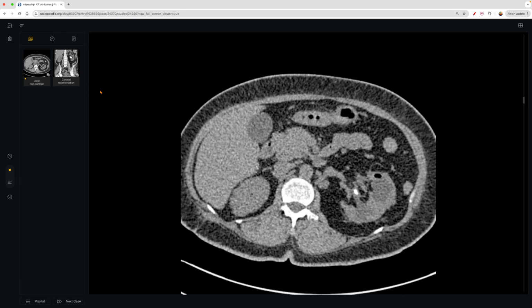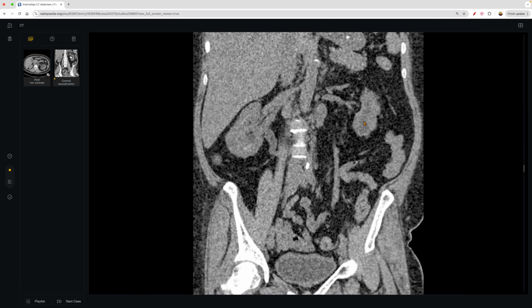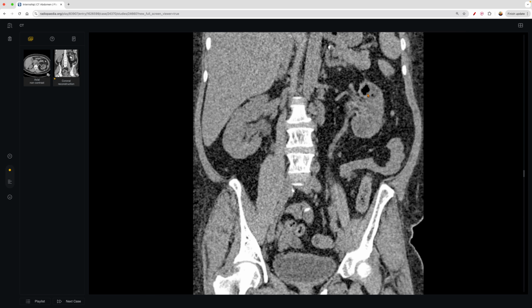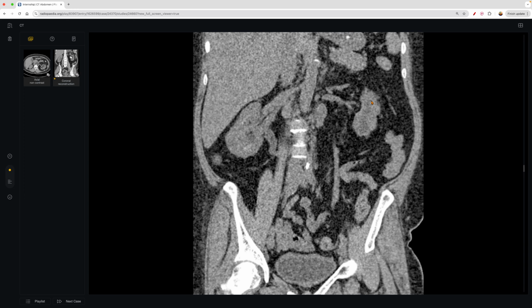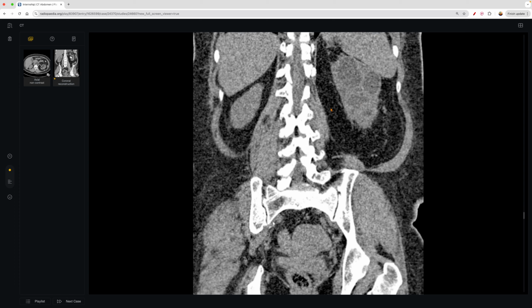All right, there's not. So that was emphysematous pyelonephritis, and this is another case of that. And you can see here as well that air within the kidneys, and then the staghorn calculus being the etiology of this. There tends to be a certain predominance in terms of the organisms that are involved.